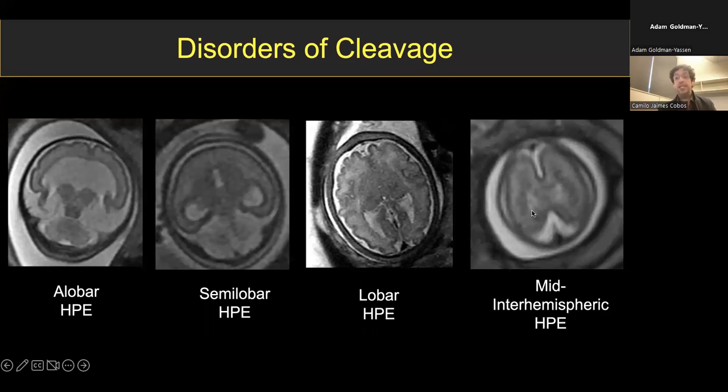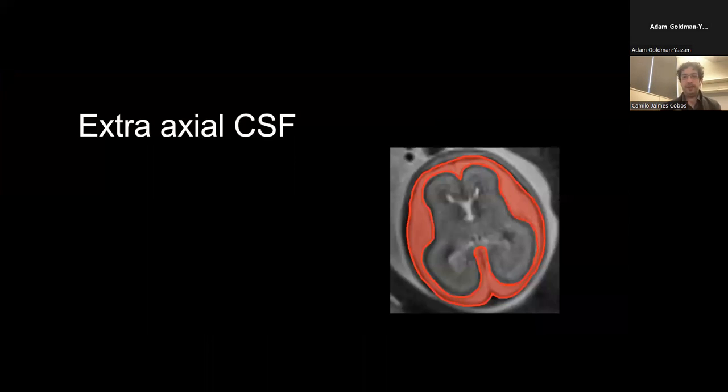And this is not the ventral, it's the dorsal. So this is a different type of holoprosencephaly, with different associations. There's some continuity in the dorsal part of the hemispheres. The corpus callosum has a very peculiar dysgenesis right in the middle of the body, corresponding to this area of dysgenesis. And the sylvian fissures are also peculiarly rotated into the coronal plane.